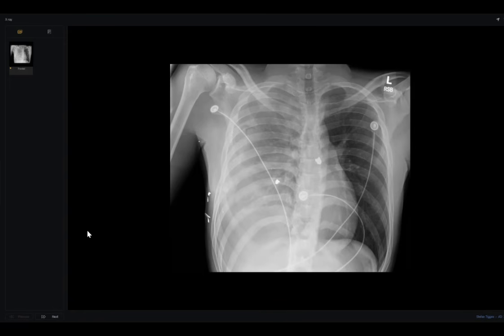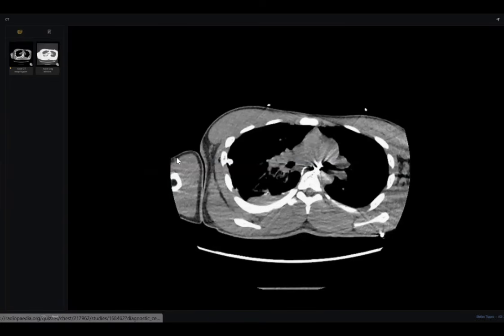I can see that the mediastinum is central in position. I can see two radio-opaque dense shadows, one overlying the spine and one overlying the right lung. They are foreign bodies. They could represent gunshots. I would like to do a CT chest with contrast for the patient.